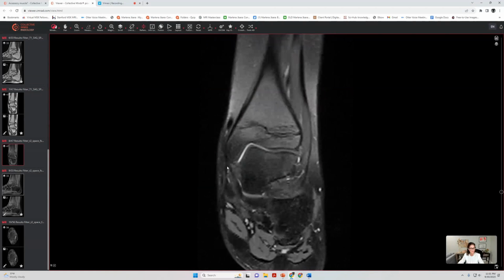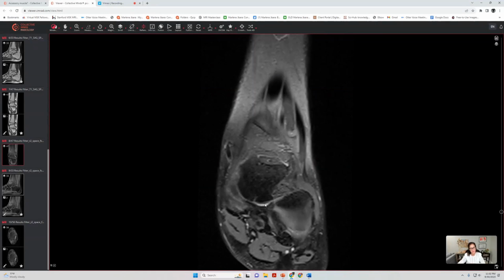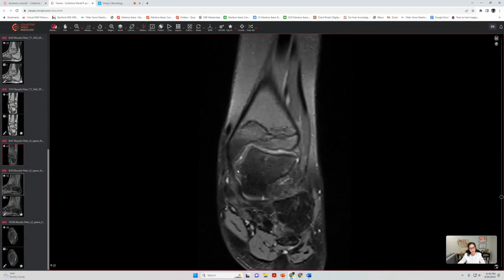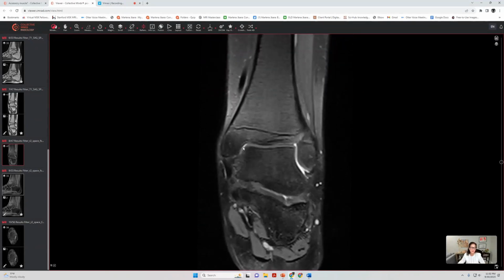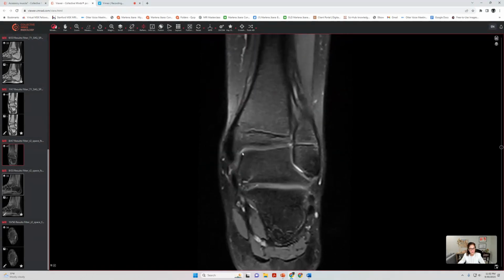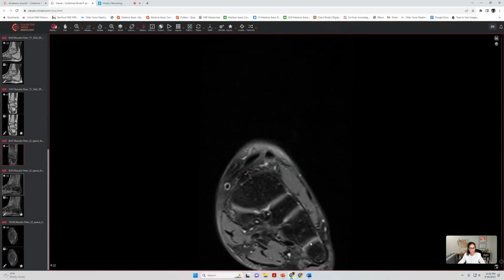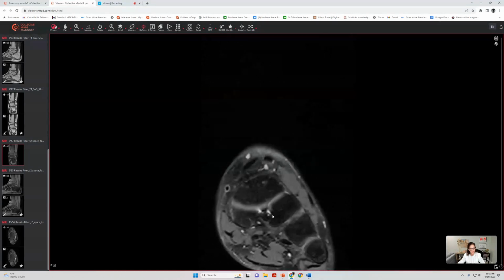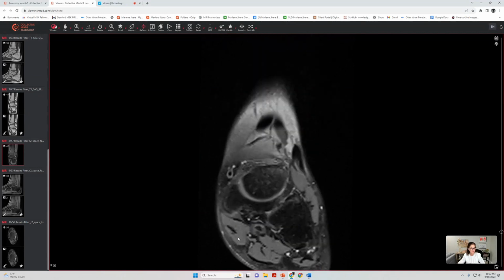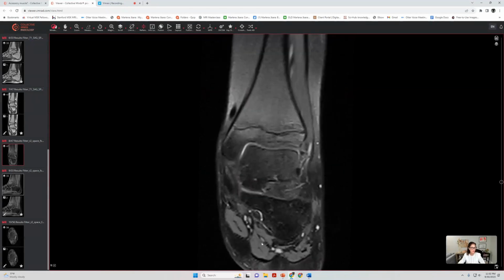seen more posteriorly. And then of course we can see underneath the talar head the fibers of the inferior medial plantar, and superomedial band of spring ligament holding our talar head. Furthermore, we can assess the bony structures by assessing osteochondral defects along the talar dome, which we can see very nicely on coronal imaging. We can see also any type of Roman arch dislocation or subluxation at the midfoot, and we can even appreciate whether or not there's any type of denervation or muscular strains seen either in the extensor digitorum brevis muscles or the plantar muscles of the heel.